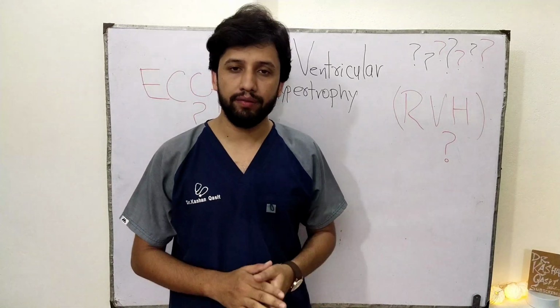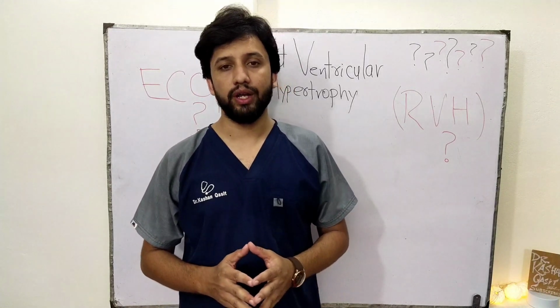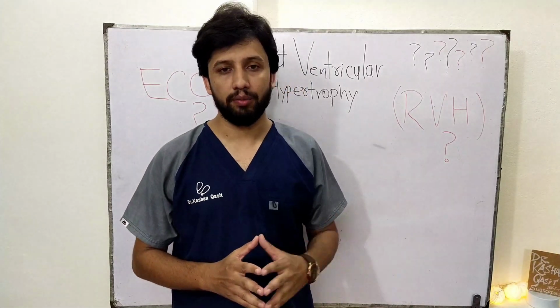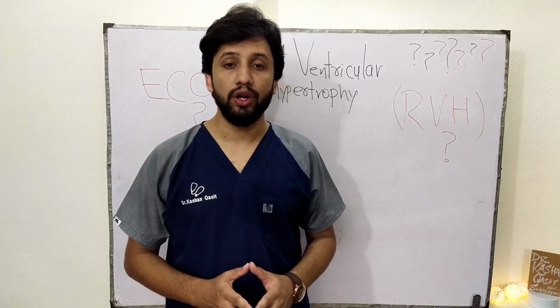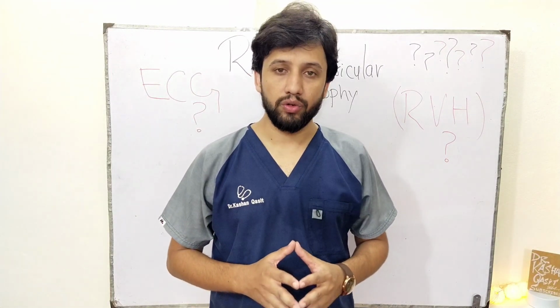Today we will be discussing the ECG pattern. In the previous lecture we discussed left ventricular wall hypertrophy, its causes, and some of the images or ECG patterns regarding this topic. Today we are going to discuss another topic, which is right ventricular wall hypertrophy.